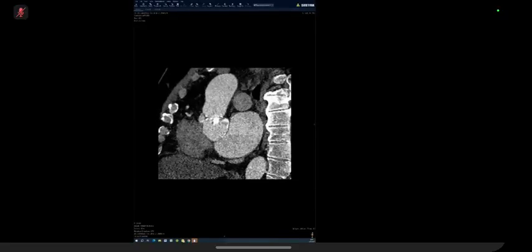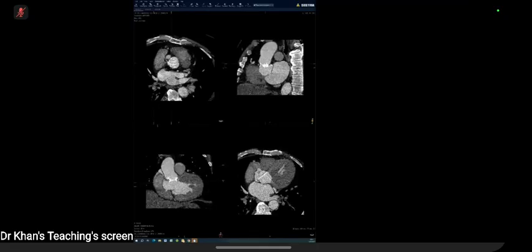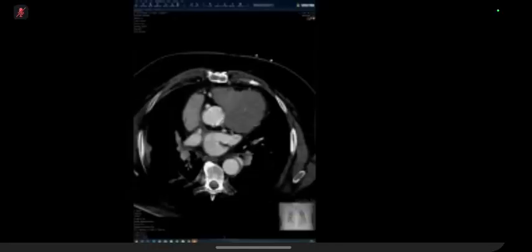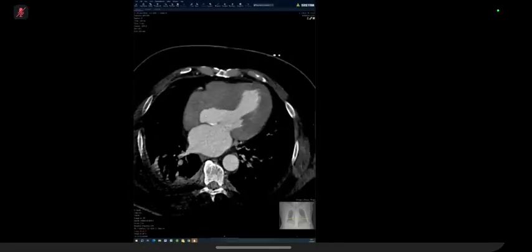Yeah. Is it an aneurysm or a pseudoaneurysm? The first question. And how would you differentiate, if you can, imaging wise? And why do we want you to differentiate? So go down axial this way. You'll see again that this is the aorta. Then you have this pouch coming off it there.